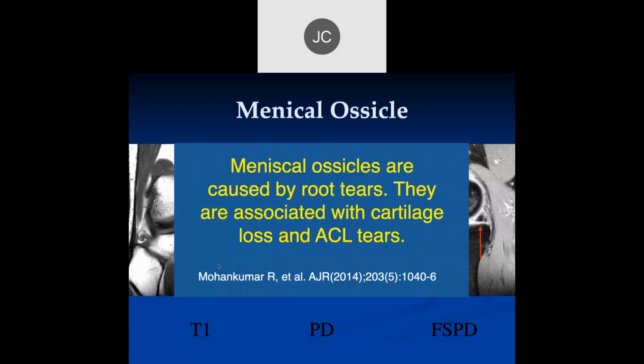So we'll see over and over again in ligaments and tendons where you can develop ossicles. I'll show examples where you have partial tears that go on over years to develop ossicles. So we know clearly now with MR that these develop. They're very rarely seen congenitally except in a few locations. So most of these ossifications in soft tissues are acquired and probably due to trauma.